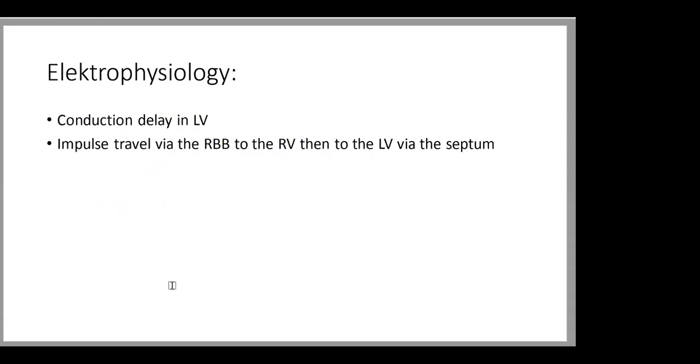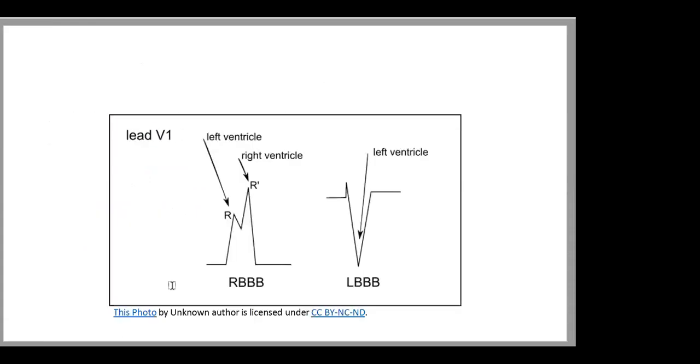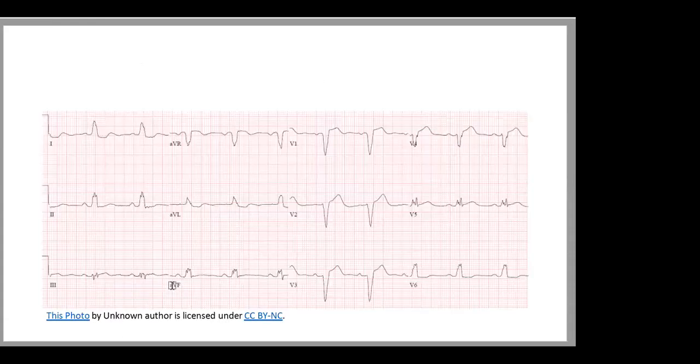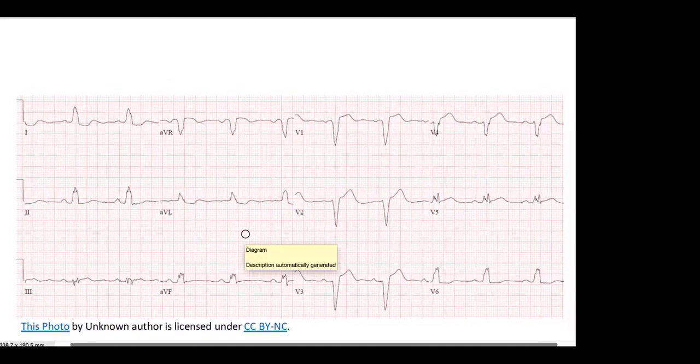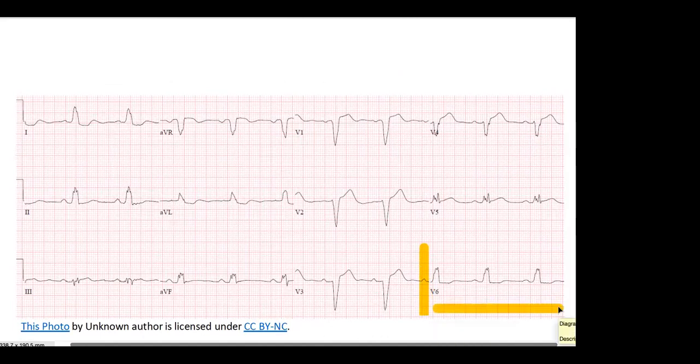Another slide. Another slide. Good. Right. Can we show the V6 here, or it's not included? Good. So we start, we have an ECG here. Can somebody tell us if you have a sinus rhythm or if it's another rhythm altogether?